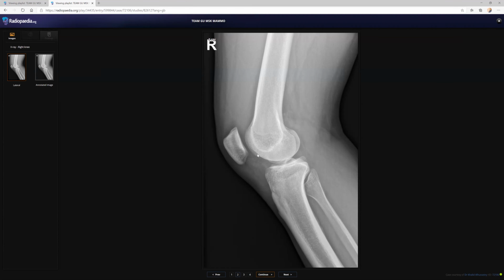Okay. So no evidence of any soft tissue swelling or any joint or cortical break that I can appreciate. Rest of the tibia and fibula are pretty normal. Patella is in the normal place, and the distal part of the femur appears normal. So to confirm any ligamentous injury or other cause of joint pain, and to look for meniscal tear, I will correlate with MRI imaging.